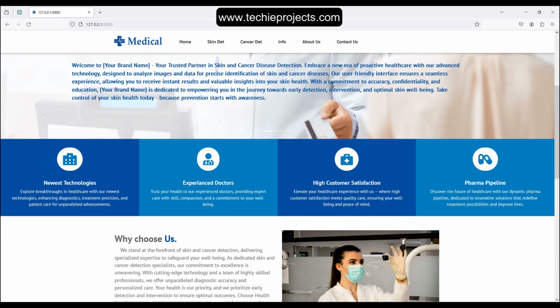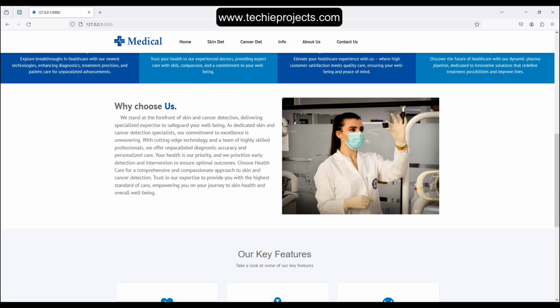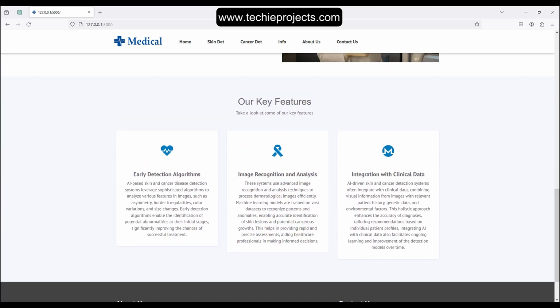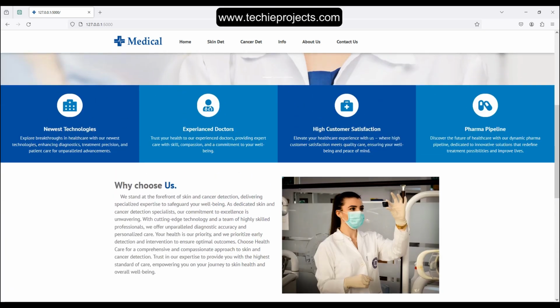So in this video I will show you the skin disease detection using Python. Let's scroll this web page. This complete website is developed using the Django framework.